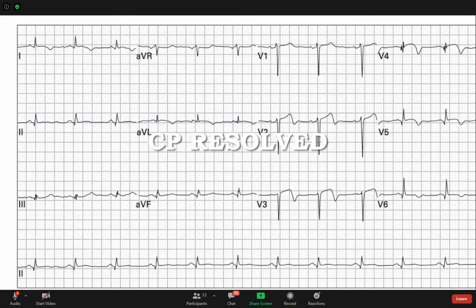وش بعدين؟ الليد 1 والليد 2 بوزيتيف. lead 1 و lead 2 positive فايش بيكون الاكسس؟ والاي في اف بوزيتيف. فمعناها which axis is normal axis. نورمال اكسس. خلصنا rate و rhythm واكسس بعدين باقي الانترفال. كيف البي ار انترفال حقك؟ Normal.